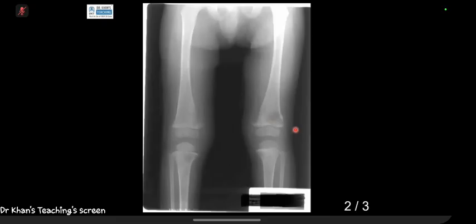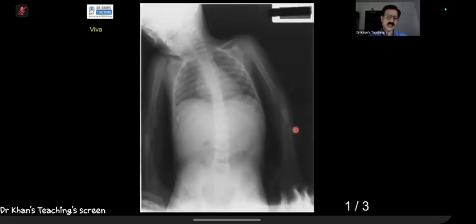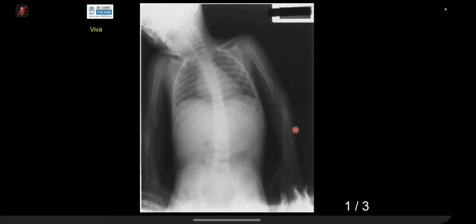According to the patient's age, is skeletally immature. I will think about metastasis. It could be due to metastasis from neuroblastoma tumor if the patient is a known case. Now, this is the X-ray of the patient. Look at the abdomen. I can see that there is enlargement seen in the left upper quadrant extending toward the abdomen. It could be due to neuroblastoma tumor.